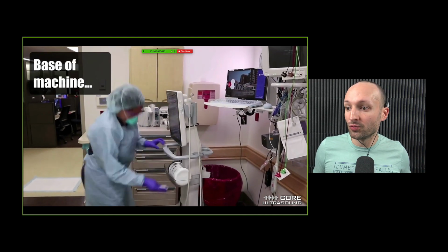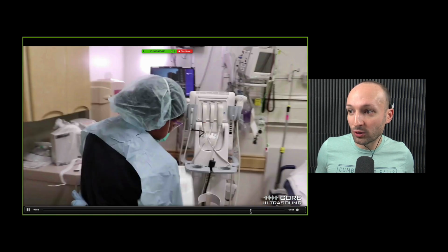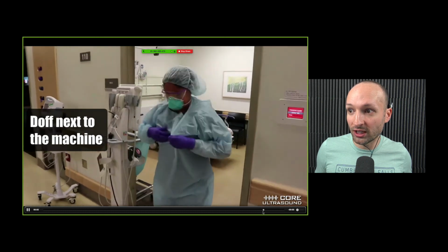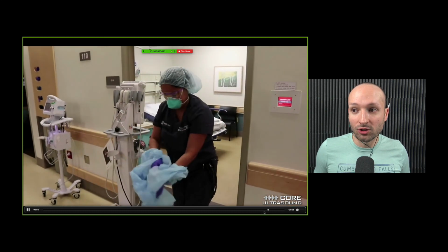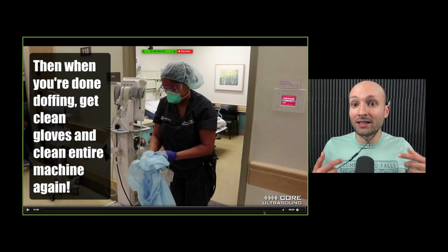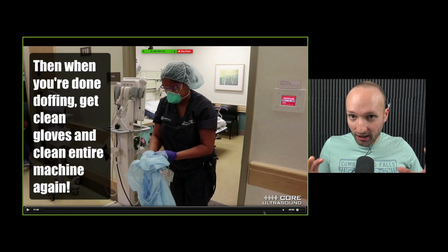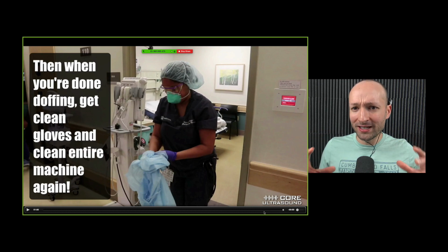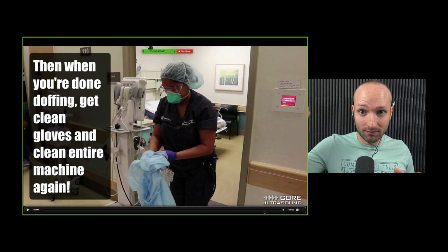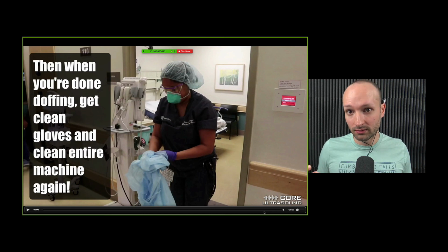And then after you've doffed, I'm just going to kind of fast forward here. So after you clean it the first time, you're going to wheel it out of the room. Go ahead and do your doffing outside of the room, and then clean the machine a second time. Yes, a second time. That's kind of annoying, I know, but this thing's airborne, right? So after you clean it the first time, between wheeling it from next to the patient's bed to the door, theoretically, it could have picked up some COVID, right? So once you wheel it out, clean it a second time.